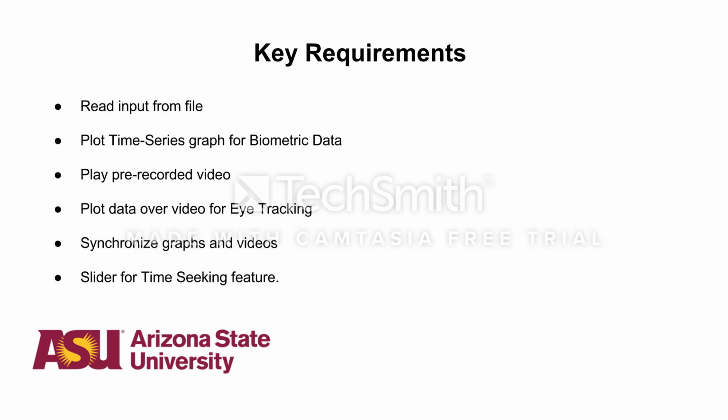This next one is for the user video from the camera. We already have this recorded video, so we read the file and we display the video to the user. And the fourth requirement is to plot data over video for eye tracking.